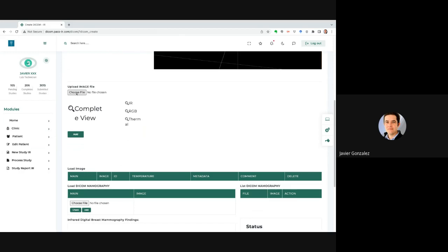It's taking a little bit. I don't know if you can see, I think you cannot see the window. I'm choosing a file. I mean, a new window appeared, but since I'm only showing just this window, you can't see the other window.